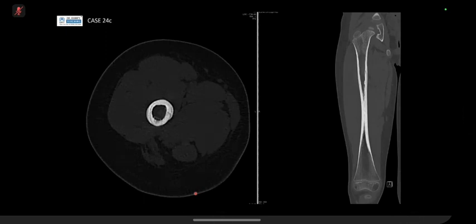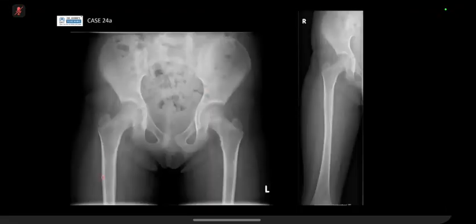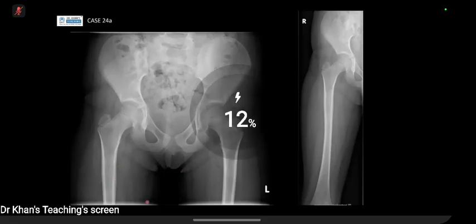Okay, so fine, I see where you're going with that. Let me just go back to that. So I think we mentioned the periosteal reaction here. Not much in the way of lytic or bony destruction or osteopenia. I mean, the bone densities look quite similar, apart from that periosteal reaction that we can see.